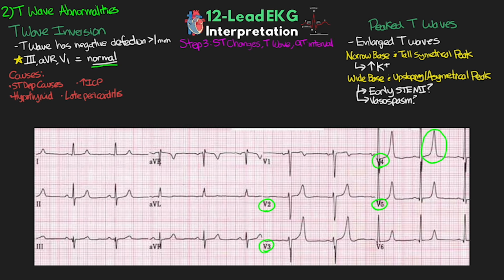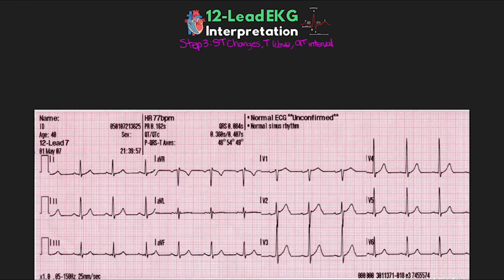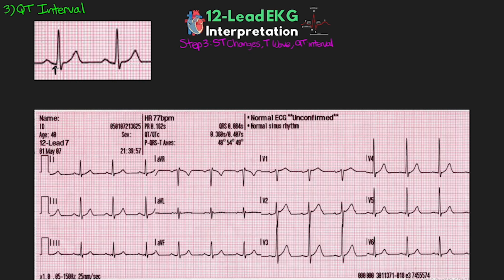All right, so after evaluating our T waves, finally we want to evaluate our patient's QT interval. And this is going to be the start of the QRS complex to the end of the T wave.